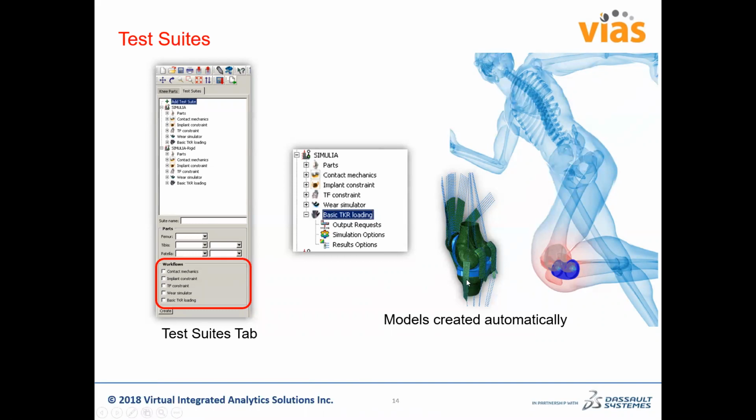If bones, cartilages, and all these structures are required, those will be included by AKS automatically. When I say automatically, that means that bones, cartilage, and all these structures are available within AKS, which is a right knee structure. But that doesn't mean that you can't do a left knee implant simulation. The left knee implant will be mirror imaged and still be simulated using the right knee setup.